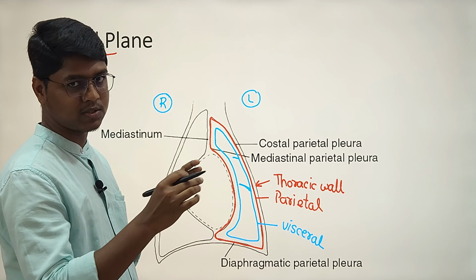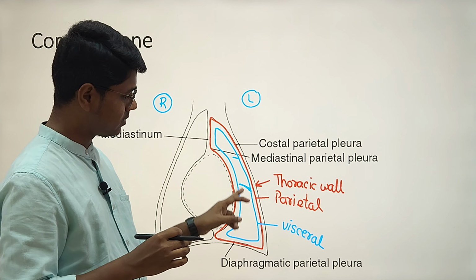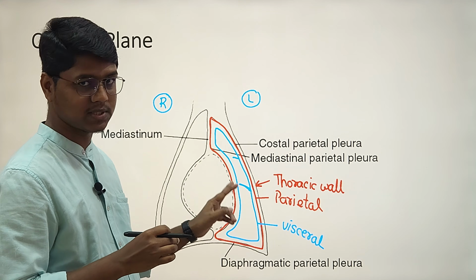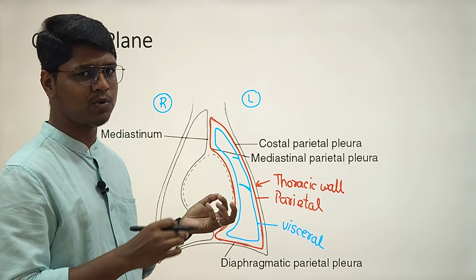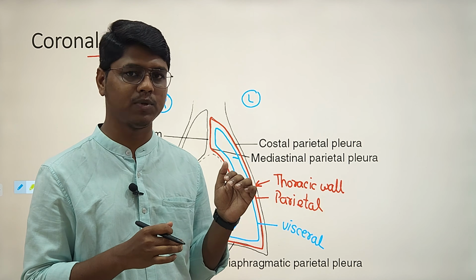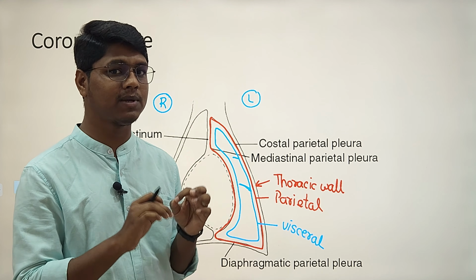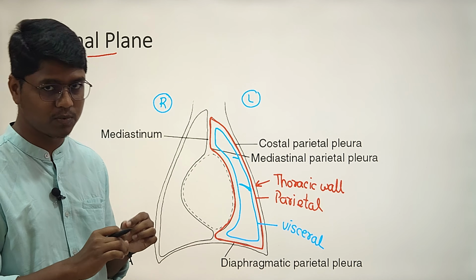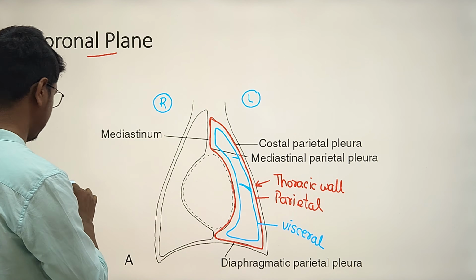When you are discussing pleural effusion radiographically, the most noticeable factor is these fissures. One of the radiographic signs is finding these fissures. Normally these fissures are not visible radiographically. There are some 5 to 6 signs of pleural effusion. If you are not finding all of them and only finding this fissure, it may not be clinically significant. You should know that these fissures are visible radiographically in some patients, but normally they are not visible.